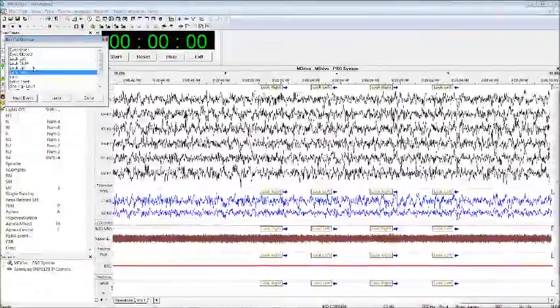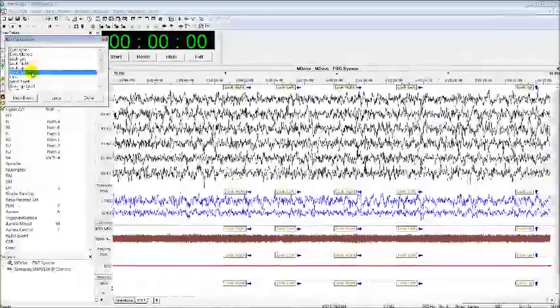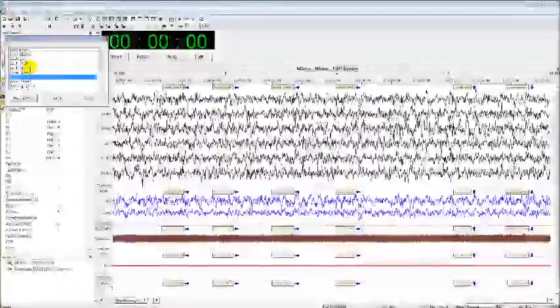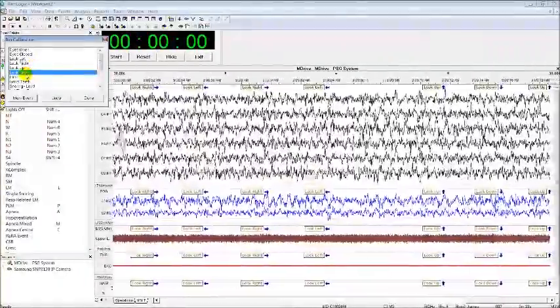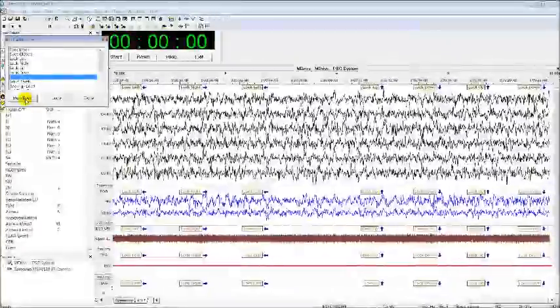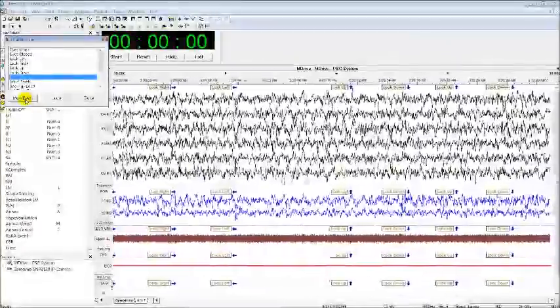Okay, then I'll ask the patient to look up and down 2 times. So up, down, up, down. Now please note that I did not hook up a real patient on this one.